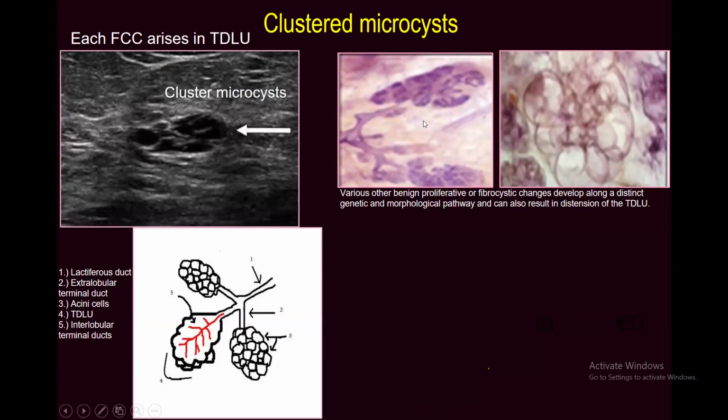Okay, so as you have seen here, the most representations of these structures is histopathology. And when we look at this histopathology image, we could imagine exactly what it looks like. But this is the extralobular terminal duct, and this is a lobule. These are normal. And this one definitely here, the acini are cystically dilated. If we look at this one, there are multiple cysts here.